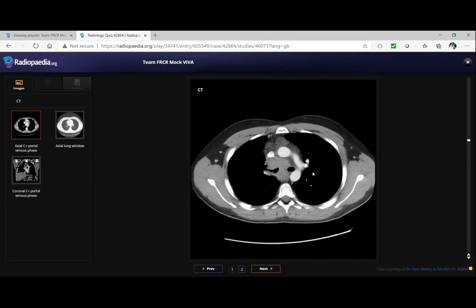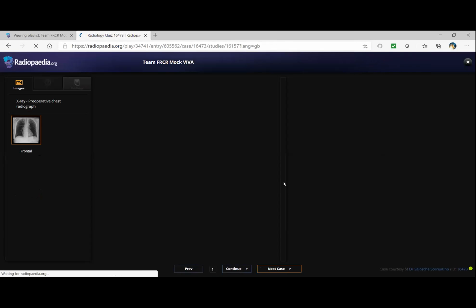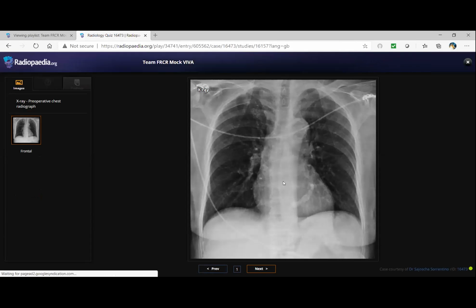Okay, so you would raise the possibility that this patient is either an idiopathic process, or that he was exposed to TB, or he was exposed to histoplasmosis. Okay, so this was described really well. But the calcifications would have given you a hint about the fibrosing mediastinitis.